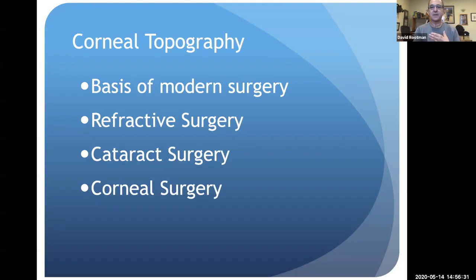If you're looking at the toric lens, some of the information comes from the posterior surface of the cornea, but it's not very much. I mean, it's maybe 5% in extreme cases. There's the rare case where things are way out of whack because of the posterior surface of the cornea. It doesn't really contribute very much astigmatism. And the fovea as well doesn't. So it really tells you what's going on with the lens, either the natural lens of the eye, or in the case of a toric lens, it tells you what the power is. So for instance, it's really useful if you can't dilate, if the pupil will not dilate enough to give you the marks that you can actually see where the axis of the cylinder is. So even in a small pupil, you can figure out where that toric lens is. Does that make sense?